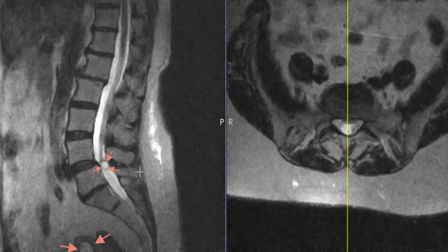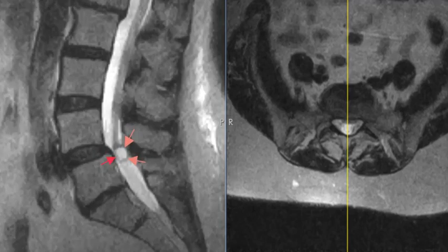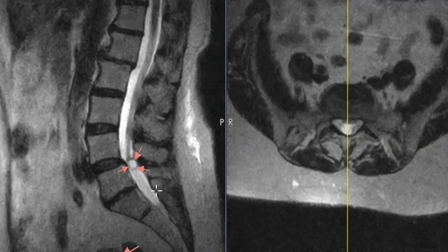Now we're going to go to this view. We can see, let me zoom it on up here. We see a little round area that's white. We're really hyperintense on this. We call this a hyperintense T2. T2 is the sequence where fluid is bright. So we know that this is very bright, so it must be fluid signal, which is compatible with a small cyst. The patient also has some fluid here in the back of the subcutaneous fat, just dependent edema back here.